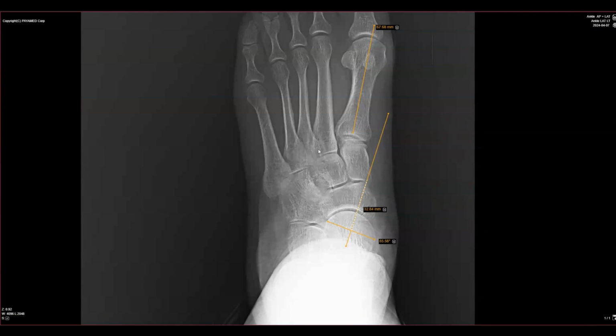Looking at the midfoot, we can see that there's some degree of overlap at the metatarsal bases. When I see the third metatarsal base overlap greater than 50% on either side from the base, I think about moving towards forefoot inversion. Eversion is the opposite, where we see the metatarsal bases very well. So there's some forefoot inversion compensation here. A little bit of subchondral sclerosis we can appreciate.